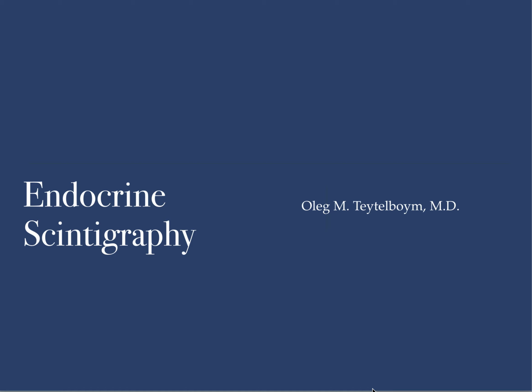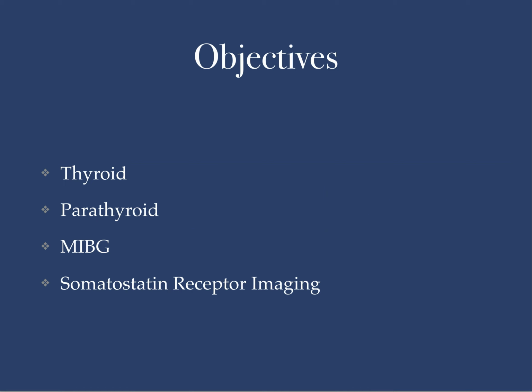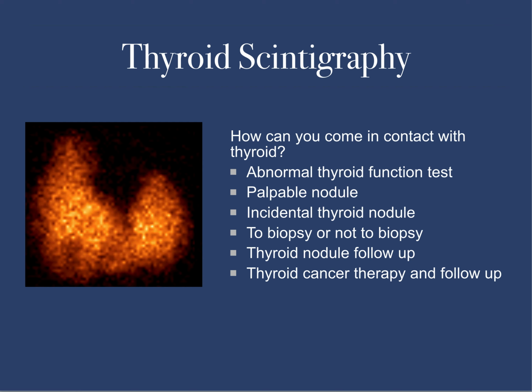Good morning. Today we're going to be talking about endocrine scintigraphy. This encompasses thyroid, parathyroid, MIBG, and somatostatin receptor imaging. Thyroid scintigraphy, this is the most common and often the most challenging part for our trainees.